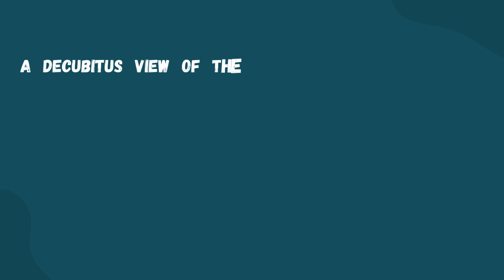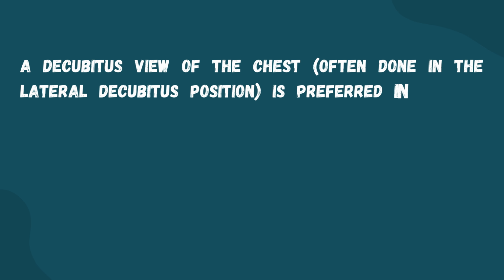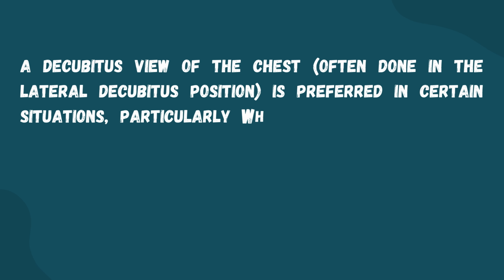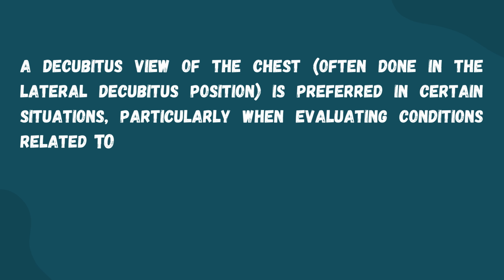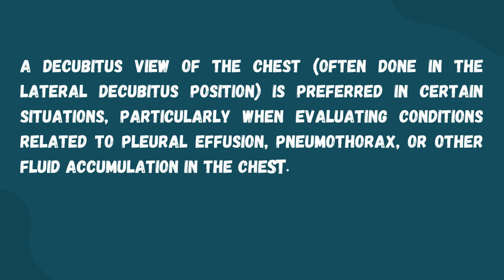Decubitus view. A decubitus view of the chest, often done in the lateral decubitus position, is preferred in certain situations, particularly when evaluating conditions related to pleural effusion, pneumothorax, or other fluid accumulation in the chest.